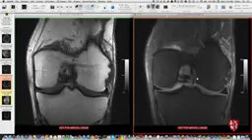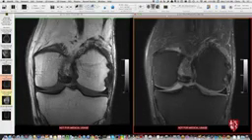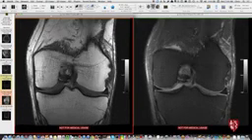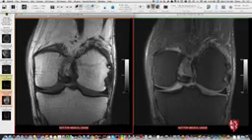All right, and then we're going to go over to the lateral collateral ligament complex. And the fibular collateral actually comes off of this irregularity on the lateral femoral condyle here. So I've often likened this to a face. I call it the cameo sign. If you imagine a person's face facing to the right here, I guess on the screen, this would be the eye, the nose, and the mouth, and this is the neckline. The convenience of that is that the fibular collateral comes right off the face. It's like that scene out of Alien or something like that. So this tissue right there, that's part of the fibular collateral ligament.